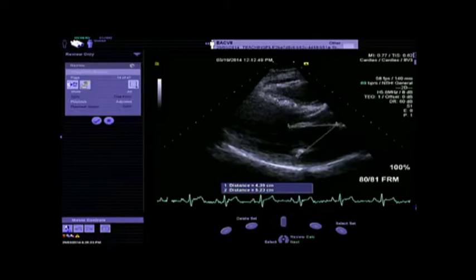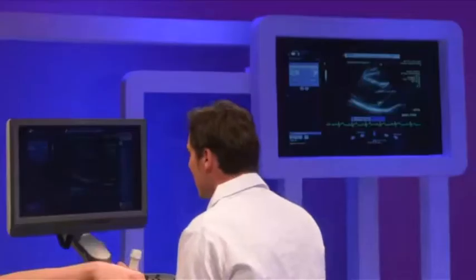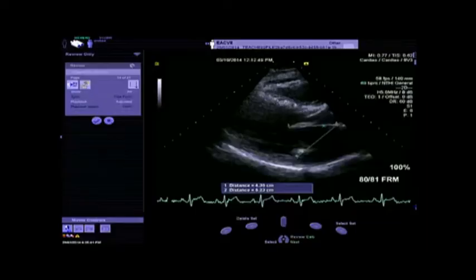and if you have the ratio of 52 above 43, you have almost 1.2, 1.3, and the cutoff to define severe dilatation of the mitral annulus is 1.3. So here we have another sign that is in favor of a failure of mitral valve repair: a severe enlargement of the left atrium when it is bigger than 50 millimeter with a central jet plus more than 3 scallops involved in the process. These are all signs in favor of a failure of the mitral valve repair.